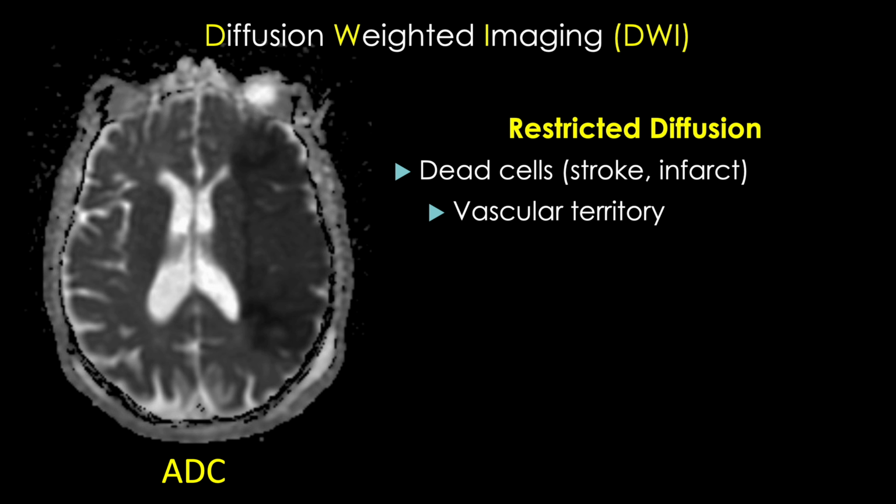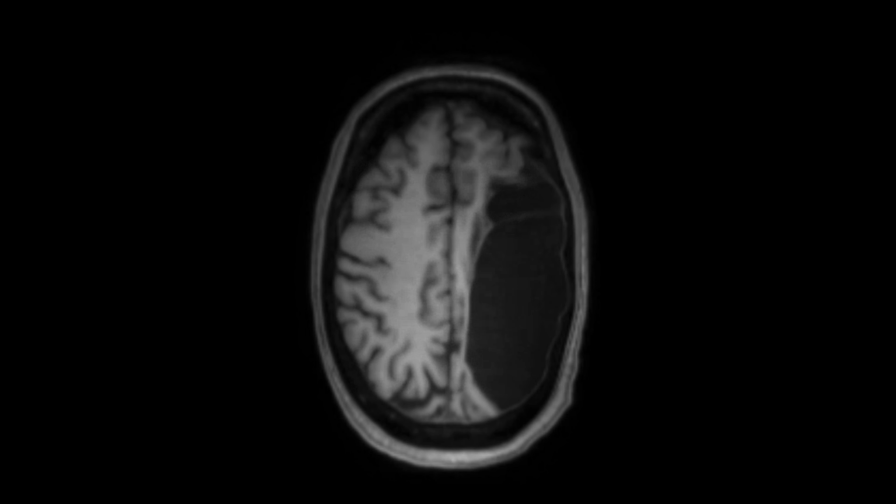So this is how an acute stroke can present, one that knocks out a large vascular territory, and the end result is not pretty. Near complete destruction of the brain parenchyma.